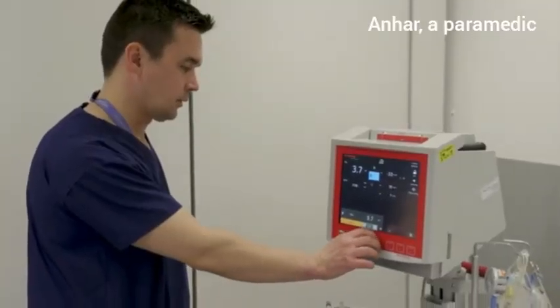Regardless of the specific configuration, the principle is the same. Deoxygenated blood returning from the venous system is drawn into the ECMO circuit and oxygenated before being returned to the right atrium. From there, it is pumped into the pulmonary, then systemic circulations by the native heart. The circuit is controlled by a console.